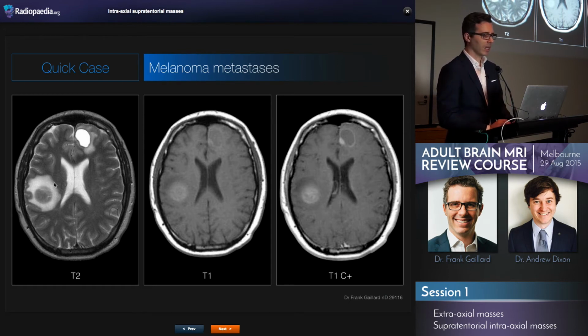And here we have one patient that shows a number of different features of hemorrhagic metastases. This is the enhancing blood sponge appearance, where you have low T2, intrinsic high T1 because of hemorrhage, but the hemorrhage is interspersed amongst a still viable tumour so that the whole thing enhances. Up in the frontal lobe we have what looks more like a cyst, high T2, lowish T1 with a mural nodule and some peripheral enhancement.